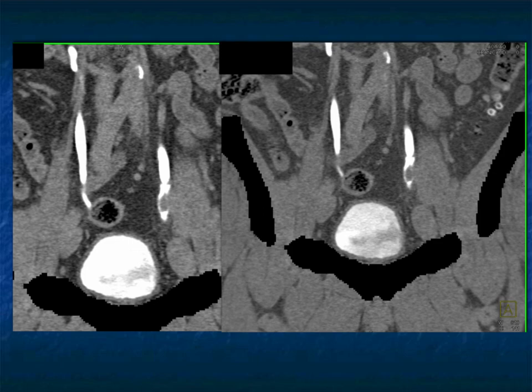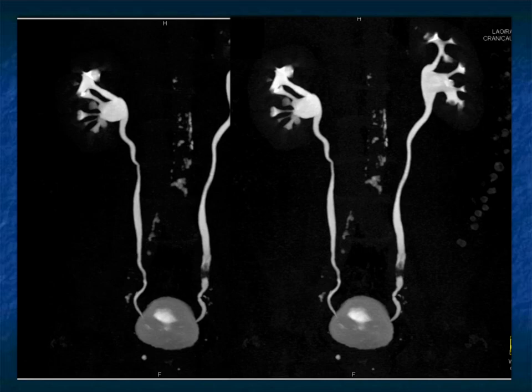If you don't pick it up, the patient will, in a couple of years, present with hydronephrosis and likely tumor spread. Look how subtle these cancers are. To me, it's very concerning because it's so easy to miss these when you're very busy. When you're evaluating patients with hematuria, look carefully at the kidney at multiple phases. Look carefully at the ureter. Look carefully at the bladder. And use techniques from coronal reconstruction to MIP imaging to volume rendering to help improve your accuracy. That indeed becomes very, very important.